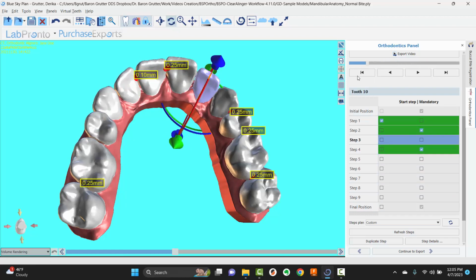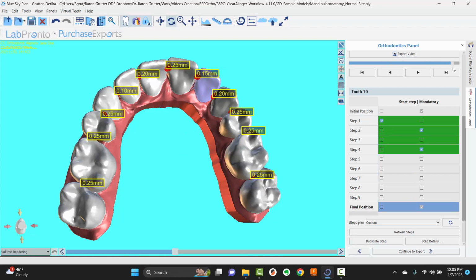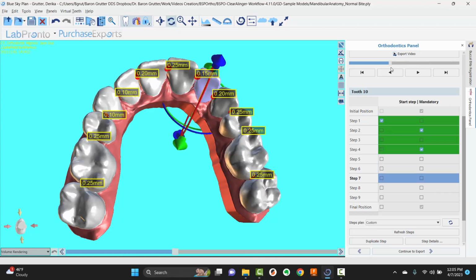That fixed it. I'm going to show you this spot right here where it's 0.25 at the end, and it does get at one point to 0.35. I might just ignore that personally, but since I know that on the other side of the tooth I've got 0.25, and at that point I've got just 0.1 right there of IPR, I'll go ahead and fix it.